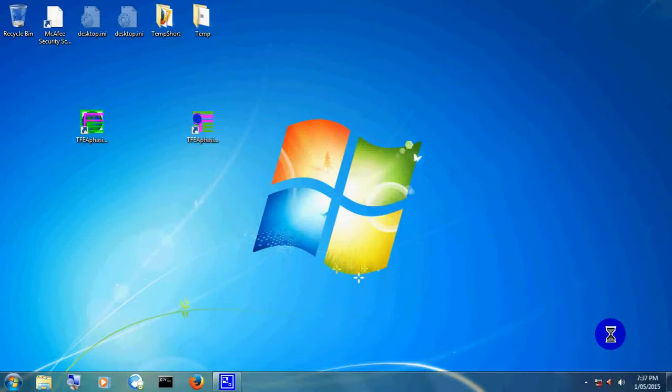Hi there. I'm going to now walk you through how to do the administrator settings, that is the user option settings that are accessible only to the administrator. This is very important because if you want to give therapy for a prolonged period of time, you should know how to manage the settings. That's the only way you can manage the database, which is very important.